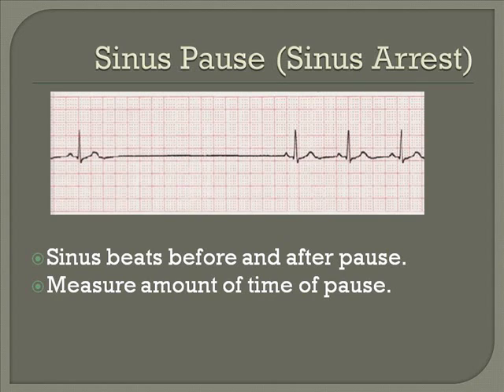Anytime they're having a pause of a second or more, that's usually something very serious going on. And it's something you need to talk to the doctor about and get the underlying issue addressed. This is usually a sign that something very serious is happening in the patient, and if it's not found, can be very serious, if not fatal.